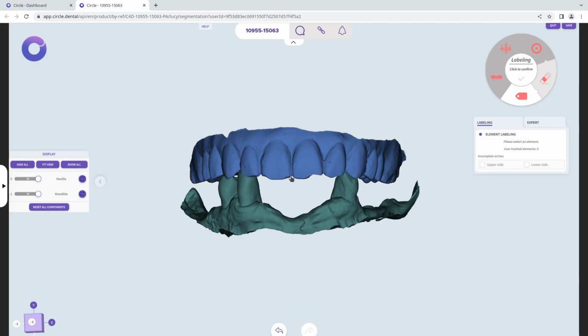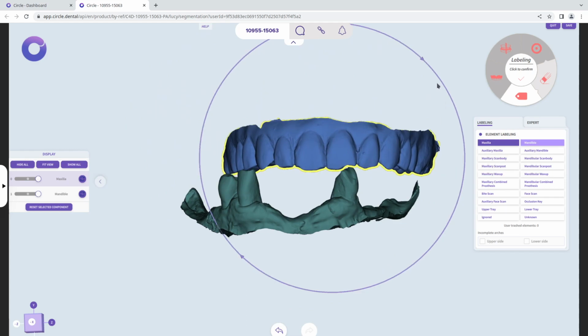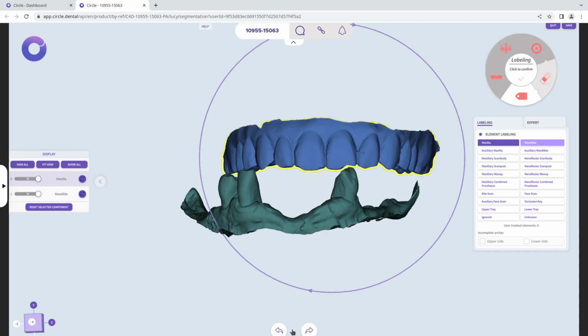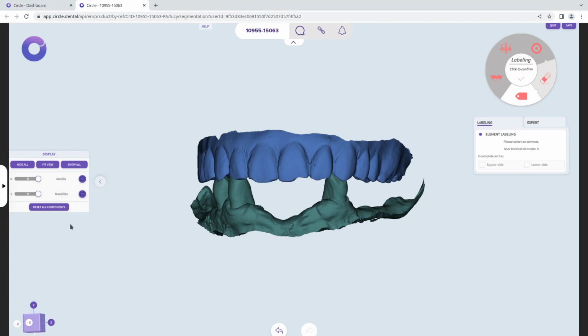Of course, you also can move the mesh directly by keeping the left key pressed, or you can just rotate the mesh in the camera angle and just use here undo or redo to make it go back to the original position. I bring everything back to the original position by pressing on this key.